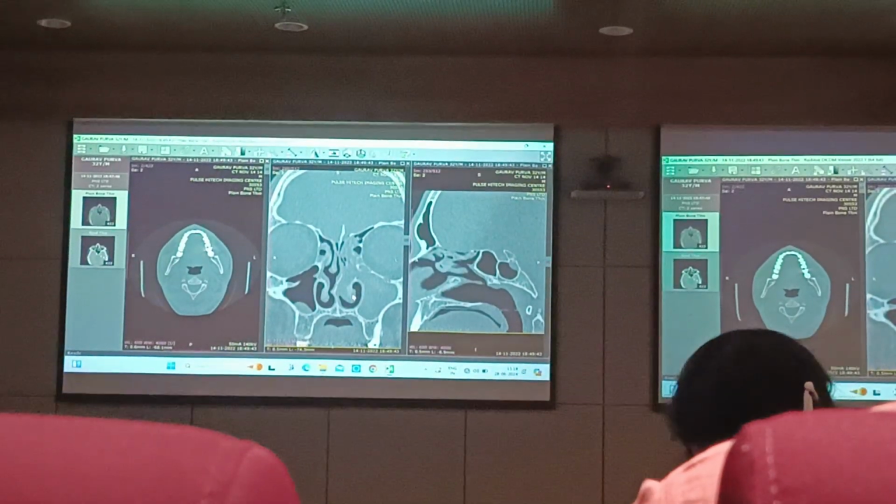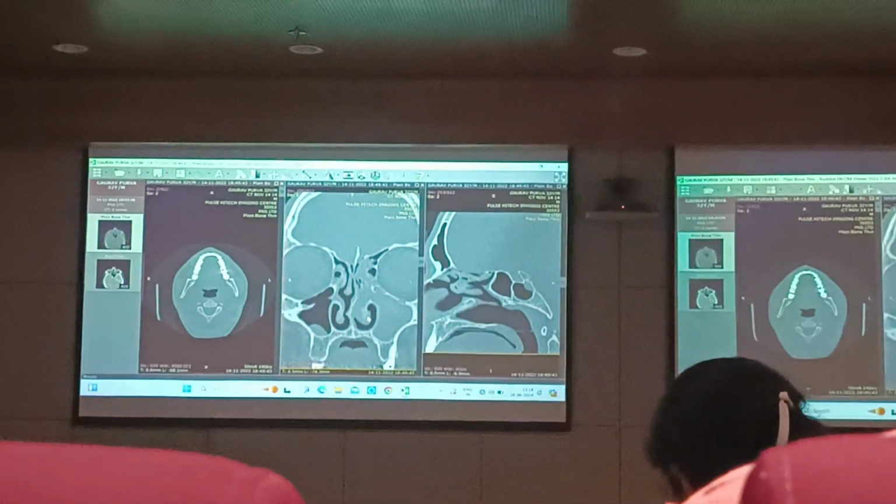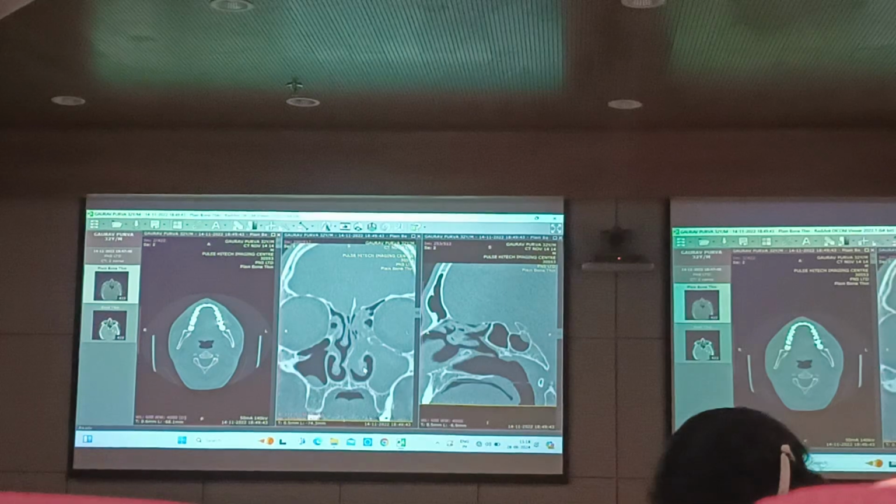Pardon? After CT you can do a biopsy to confirm? Never. Never. Have an MRI. Today you have the advantage of MRI. What if this is an angiofibroma and you biopsy it? What is going to happen?